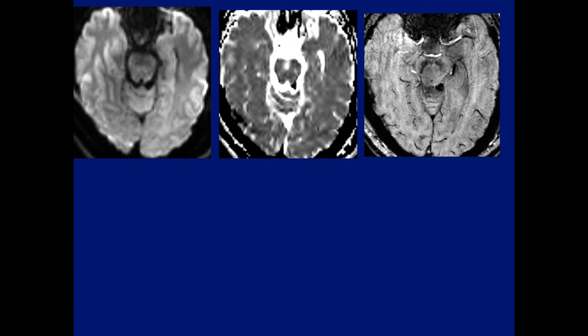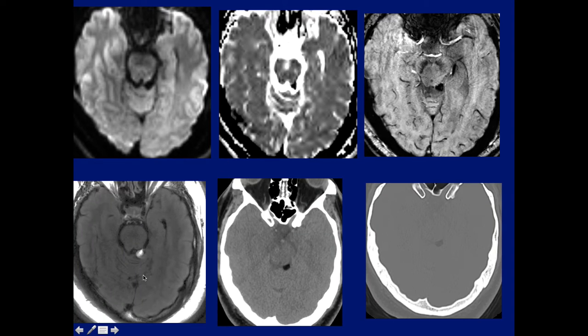What's the finding here in this patient? Correct. Eric already pointed out that this is a lipoma seen on the MR sequences. And here it is, verified on CT.